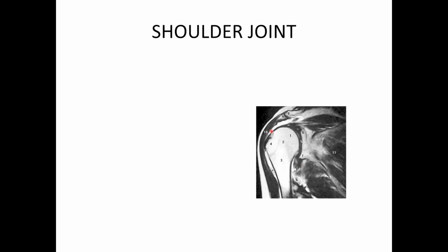Here is another shoulder joint. This is an MRI modality and oblique coronal view.